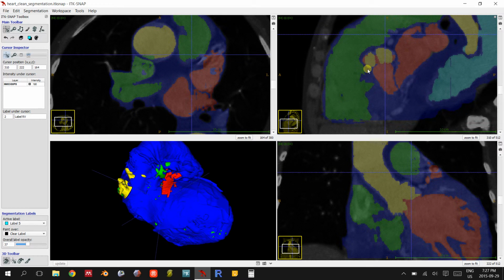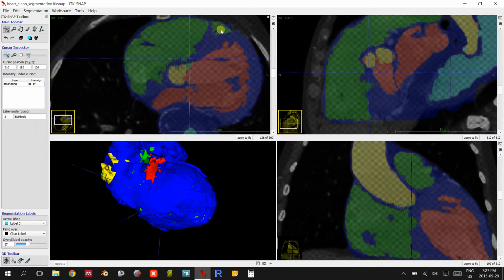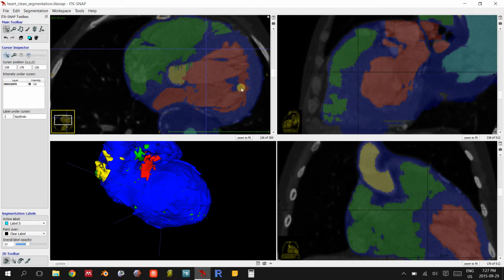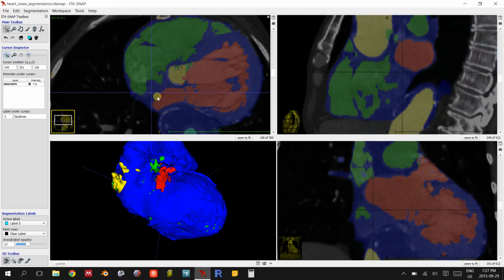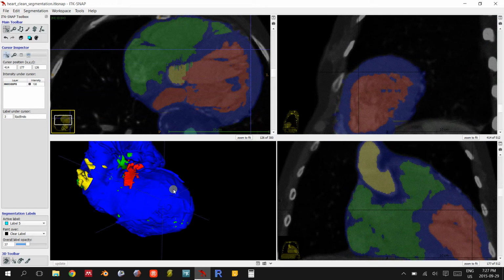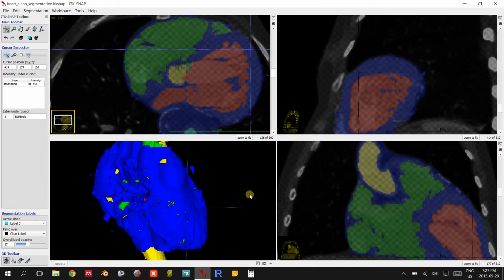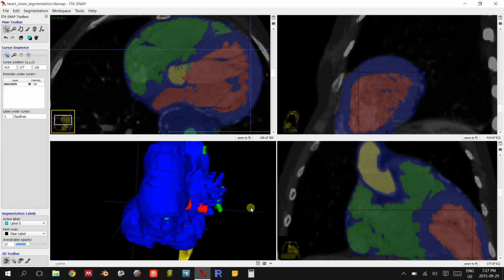There were some manual changes to be done just to fill in a couple of gaps so that, for instance, the right ventricle and the left ventricle didn't share a wall, so it looked like there was a septal defect or anything. As long as I gave it a little bit of definition and went through this semi-thoroughly, I think it looks okay and fairly accurate, but you guys will have to double check. And in this bottom left window, you just see the final 3D model that you can export out.